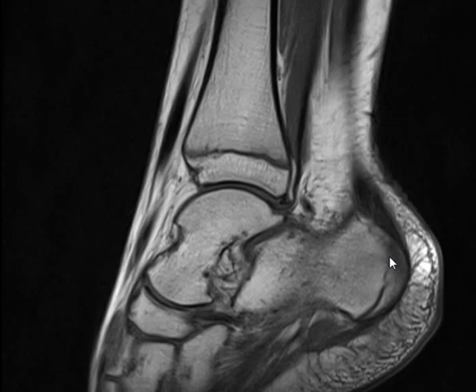So, calcaneal apophysitis or stress fracture, exactly. It's repeated trauma on a normal bone. So, regarding why it's not an infection? There must be fluid collection. Fluid collection is not prominent enough. At the tendon insertion there would be swelling, which is not present here. What else? Very important thing: fever and redness and hotness. Yes, the signs of infection are not there.